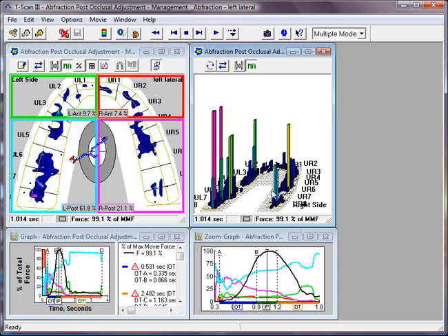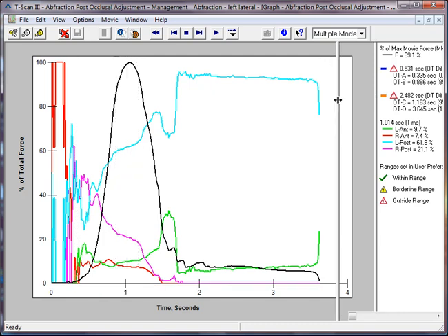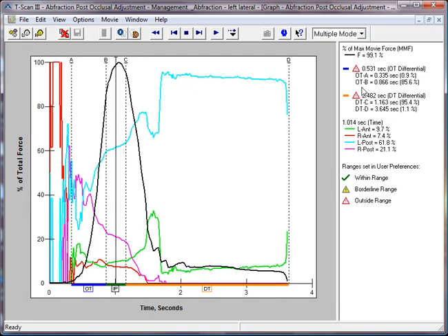so you would just bring the sensitivity down slightly. What you may also notice is that the graph window looks slightly different. It's sort of cleaner and easier to look at. The A and the B line algorithms are better, so the A and the B line are more consistently in the correct place. The C and the D line are more consistently in the correct place. And what you also have along the side of the chart here, you now have little icons that appear for the occlusion time and disclusion time.